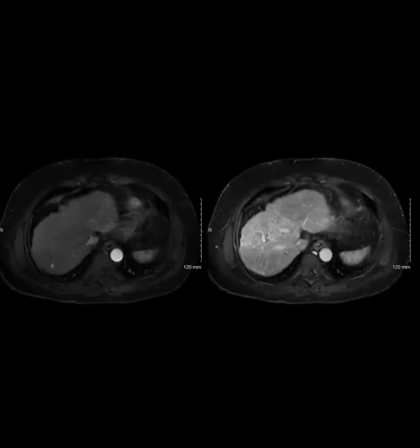Victoria, did you say they biopsied it or resected this, was it? This was an explant. That's why they were so concerned. Based on the report, they just described this foci of hyperenhancement, nothing specific, and then on path on the explant they found this fairly aggressive tumor, so they were concerned why there's such discrepancy between what the report showed and what the final path showed. But again, this is not a discrepancy, basically.